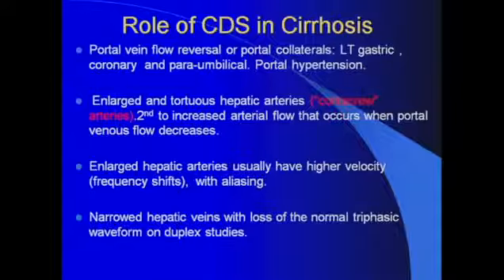And this is quite a common thing in advanced liver disease and cirrhotic patients, where due to fibrosis, the fibrotic tissue on both sides of the vein can compress the veins and create a focal area of stenotic segment reflected as abnormal aliasing velocities. In addition, spectral Doppler evaluation of these hepatic veins will help you supplement your findings, either increased velocities or loss of the normal triphasic waveform. We talked about it earlier in the evaluation of fatty liver.